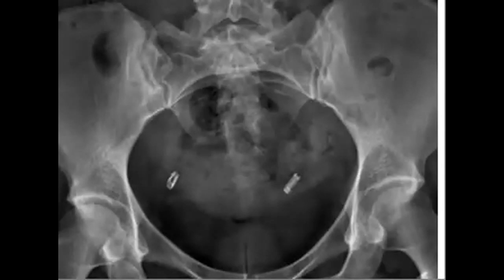So, time for the exam. Let's have a look at how it can work when you go to the real exam. Stop the review. Just before I show you some real cases, I want to show you this diagram, how you can check the checklist.